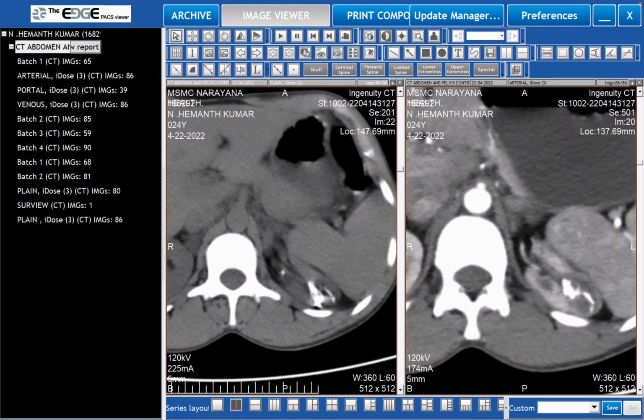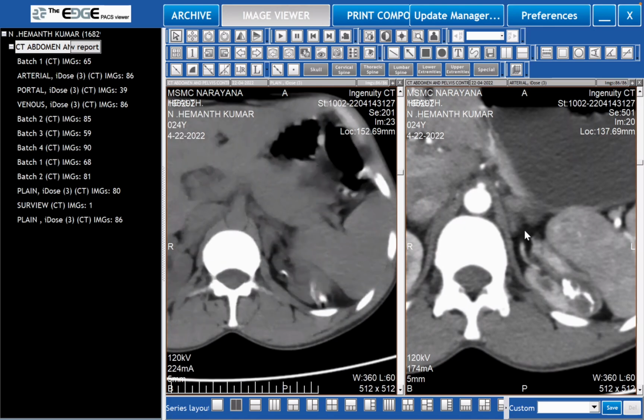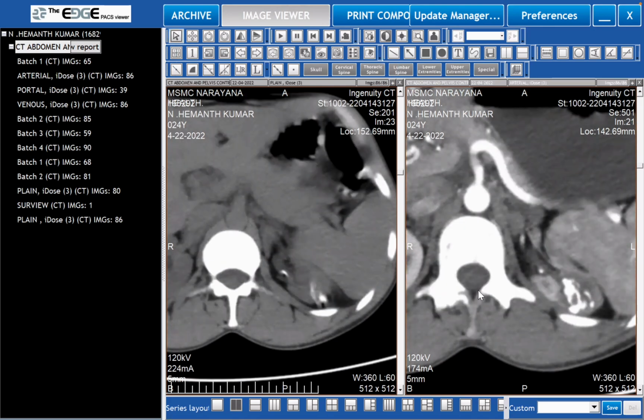What is that white structure which is coming out from the hilum there? There is one white structure in this next one. Yes, sir. What is that white structure coming out? So it could be either renal vein or artery. Vein? That is outside. In the aorta. It's the aorta. You think it's a renal vein, that thing? The artery.